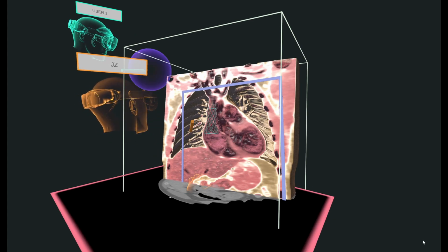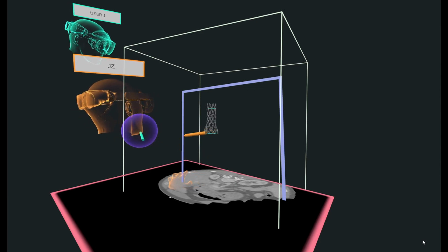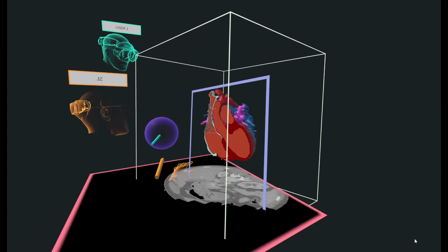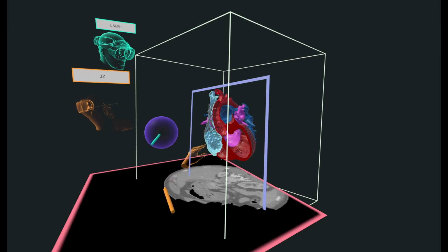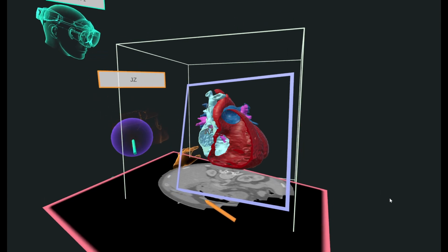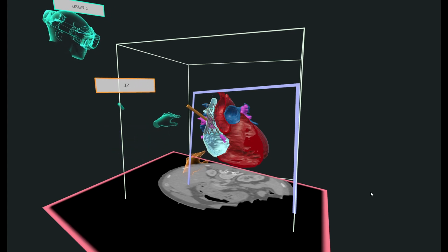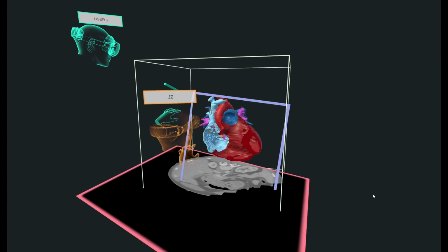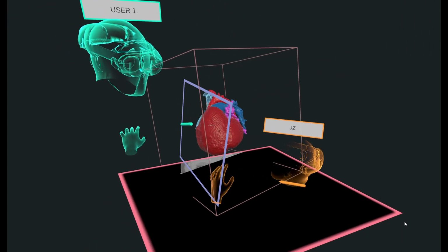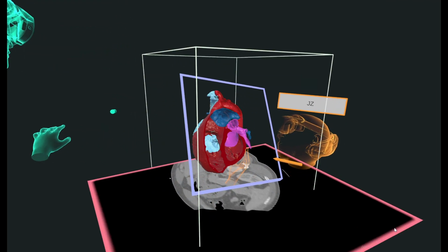But I'm going to go now to hide the volumetric. And if we actually have the time to segment things, we can show the segmented heart. It's the same way. We can see this in a very nice shell with colorful segments, and we can see the SVC. We can see how the veins are there, and it's going to be baffled in the back. And we can see that we're not covering that ASD, which is pretty low. So if we want to cover that for this defect, that's not a sinus venosus but a secundum ASD, then we need a different approach.